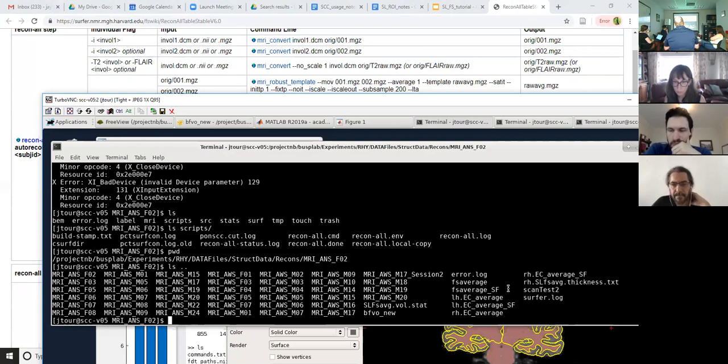So if you're generating stats tables, don't have them pop up in this directory; create another. Individual stats just go in the subject's individual directory. But if you're doing group stats, create a directory, either in here or somewhere else, called something like group stats, so that this is mainly just a list of the subjects, and then a few other files that are handy to have in here.